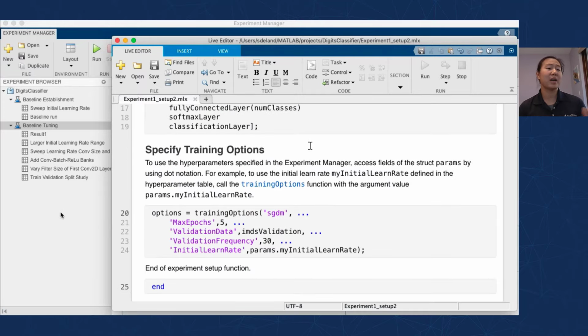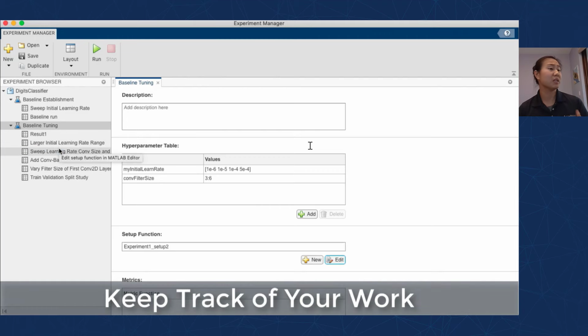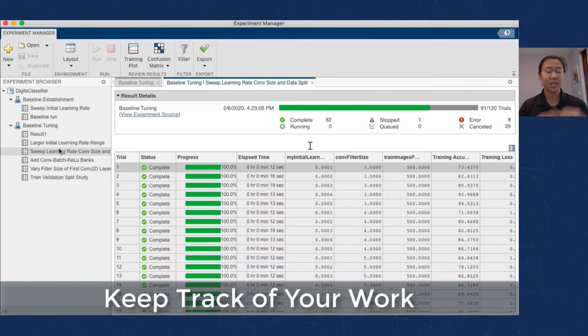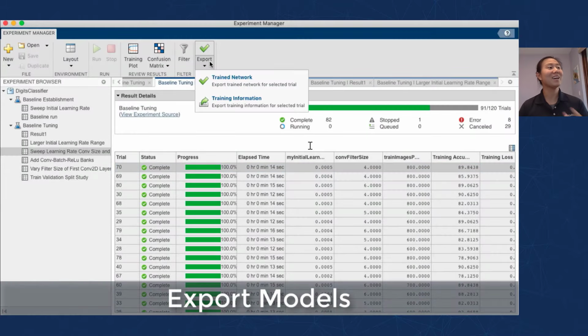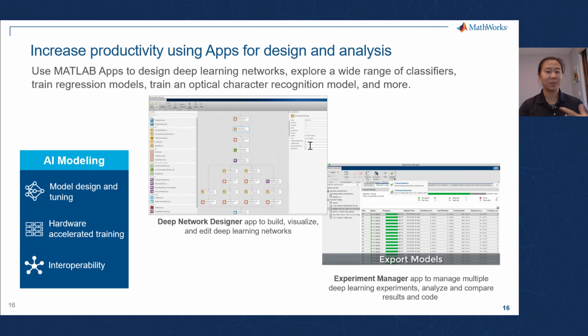It's a really great way to also keep track of your little trail of breadcrumbs, as it's really important, especially if you are working under FDA regulation, to be able to show all the exact steps that you had taken in the process of designing your model, and being able to reference back to that record can be very important. So, two extremely useful apps that I will unfortunately not have enough time to show today, but are very important to call out nonetheless.